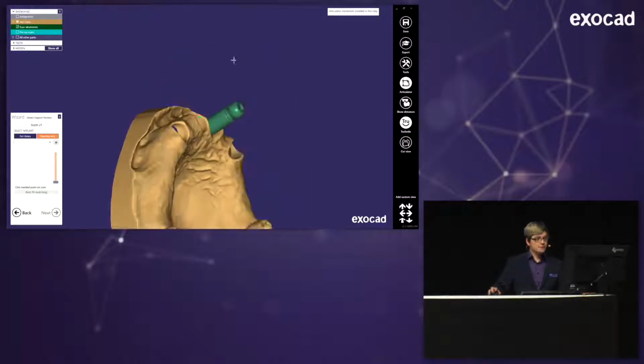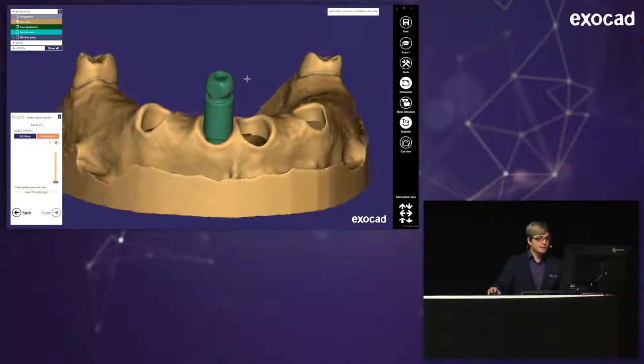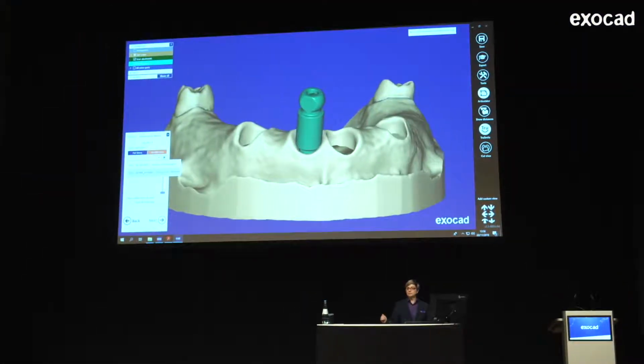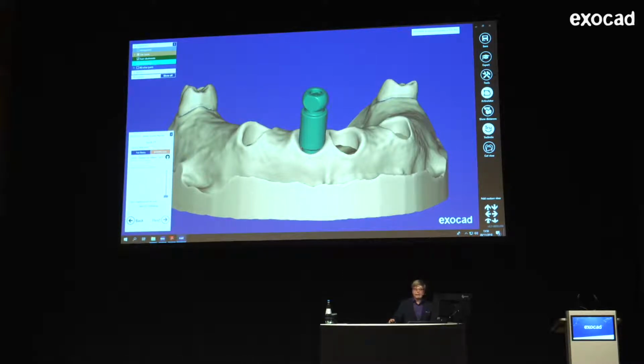So the first thing I have to do is place my abutment position. I have here a scan abutment, as you see. And I'm using only my favorites for the different implant libraries. And I recommend to any one of you who has implant cases, abutment cases, just switch off the star up here for your implant libraries.